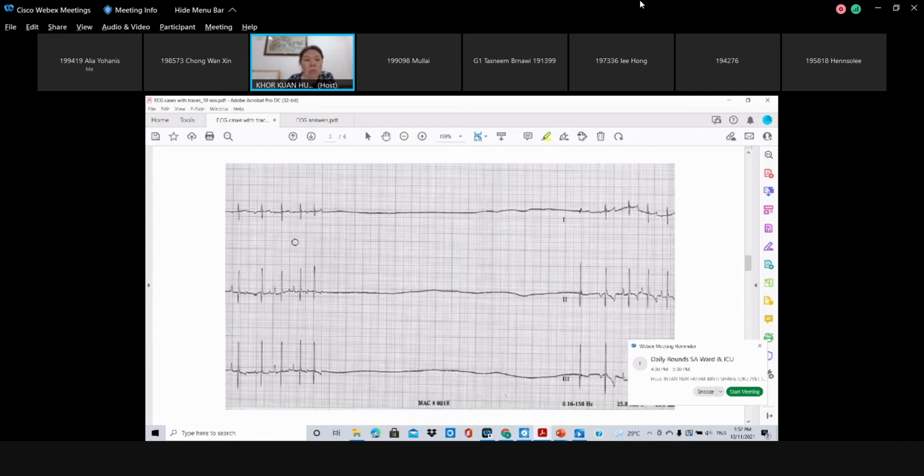The ECG trace will give you an average from here to here. It will tell you there are only 4 heartbeats in that period of time. Or if it started to calculate from here to somewhere else, the report will tell you there are 80 beats per minute. So it depends on where the calculation is.